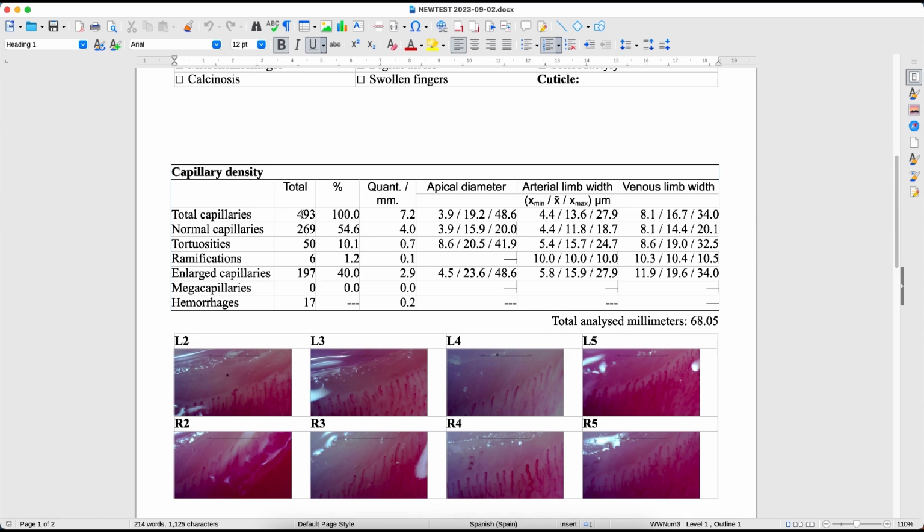These quantitative metrics are now only in this report, but in future versions they will be available as a summary and per image in the web application, so you don't have to download the report to see them, and that will also help locate interesting findings in the capillaroscopy.